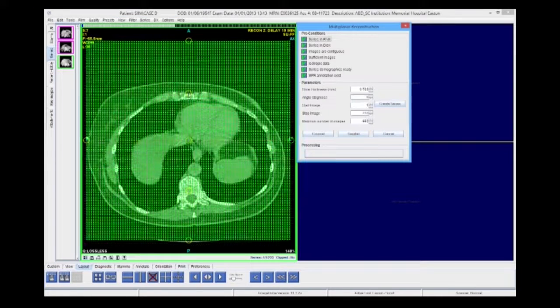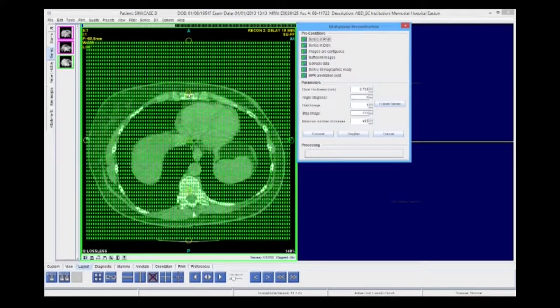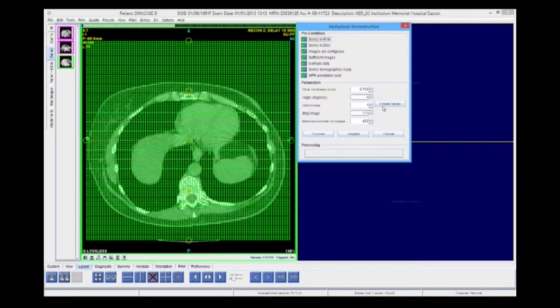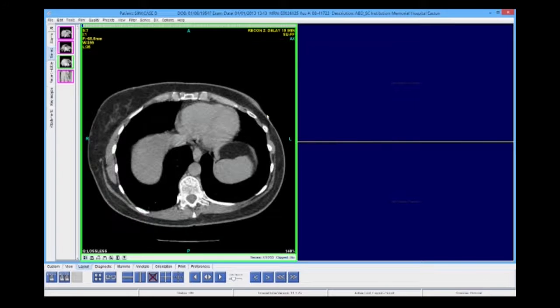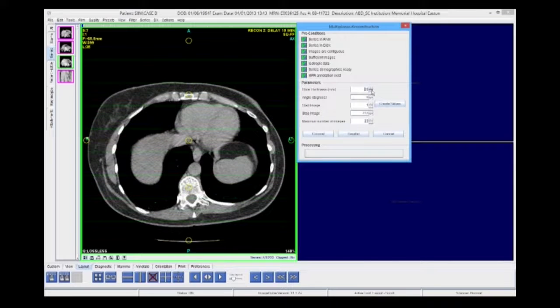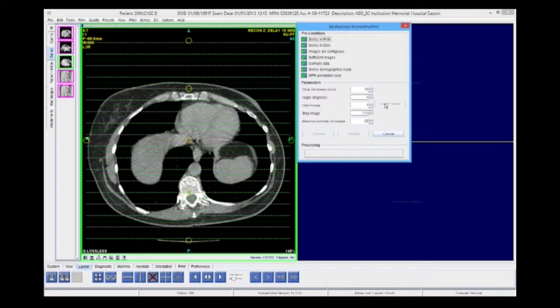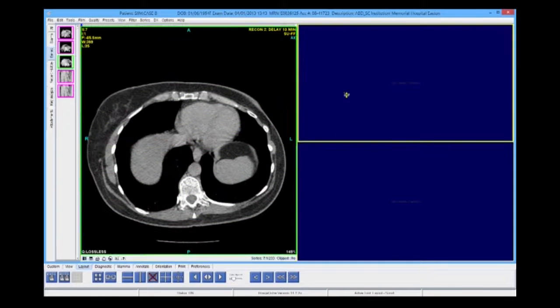The user may also select a custom slice thickness and extent of acquisition based on handles or entries into the pop-up. So a thin slice or a thick slice reconstruction can be created and are compared here.